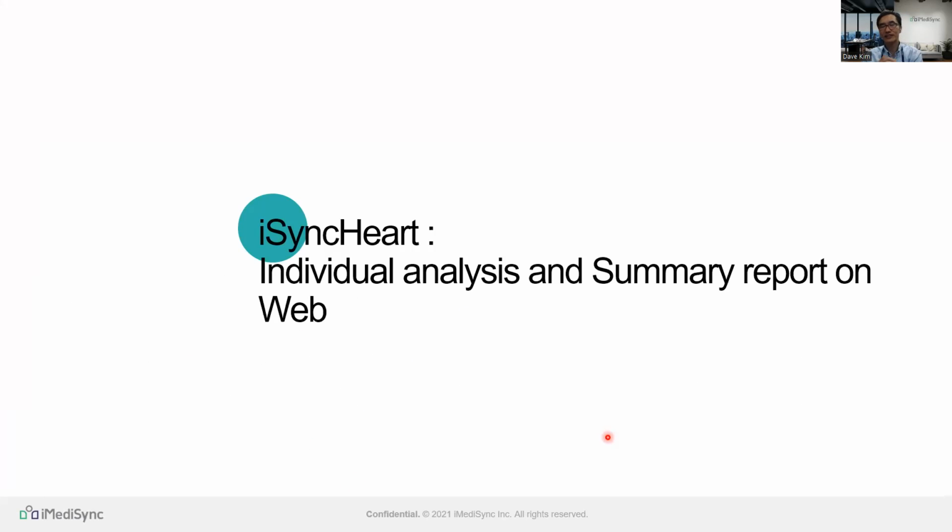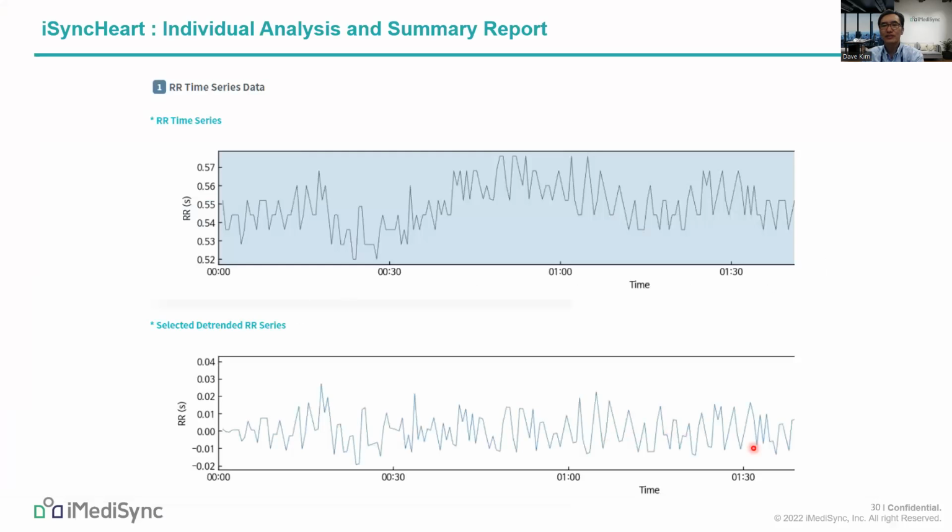Finally, in the third part, I'd like to describe iSyncHeart individual analysis very quickly. It is very simple analysis. The first item is RR time series extracted from the iSyncWave PPG recording.